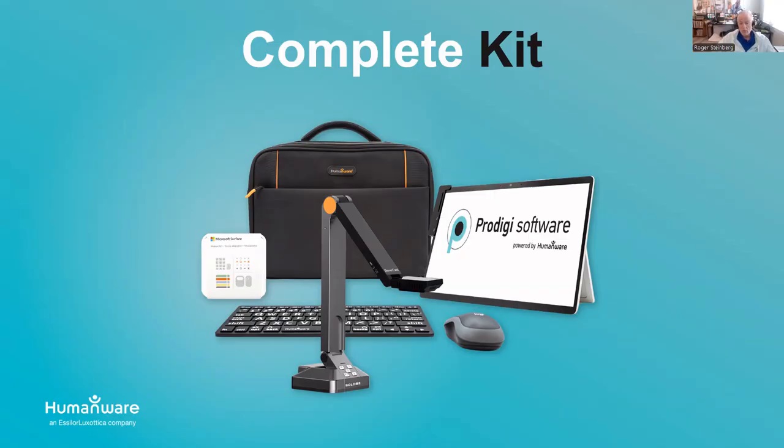That comes with the software to be installed onto it. So you can use that as a touch interface. It's highly portable and can be used pretty much anywhere that you want to use it, including when it's detached from everything, enjoying reading on your couch. It doesn't stand out on here, but on the left edge of that Surface tablet, there is an adapter that is included that provides additional USB ports and Ethernet ports and so forth for connectivity out to other devices. So you would use that to help connect up other things that you want to connect.